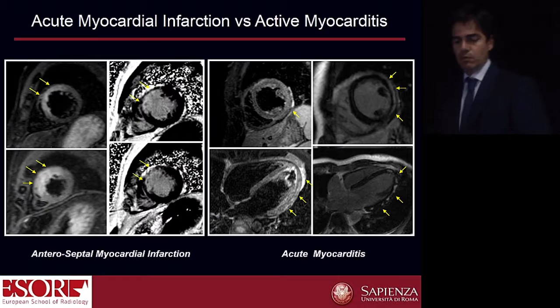Just to make it simple, differential diagnosis between acute myocardial infarction and active or acute myocarditis. We saw already several cases today. Transmural edema here, transmural late enhancement; epicardial edema, epicardial late enhancement. Two different processes sharing common pathways.